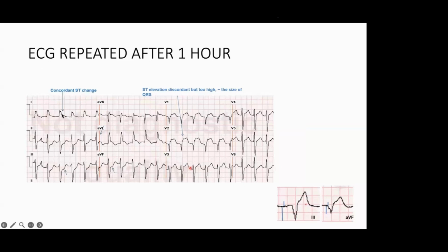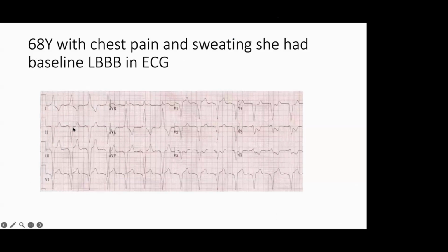In a positive QRS, the ST starts becoming ST elevation. In a negative lead, you can see concordant change, and ST depression sets in. In a negative wave there is ST depression, and in a positive wave we see ST elevation.